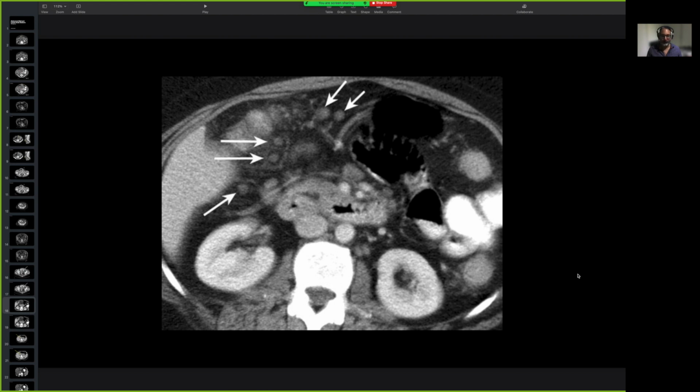Now those lymph nodes. Okay, people, mesenteric lymph nodes. This is important because you should know your lymph node stations. I mean, abdominal lymph nodes is a real issue. So what lymph node group do you think this is?